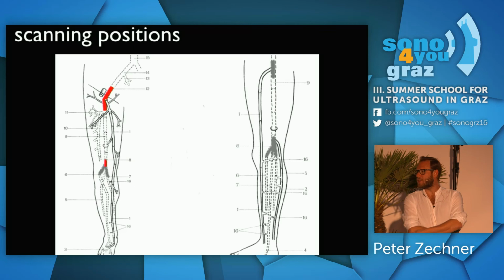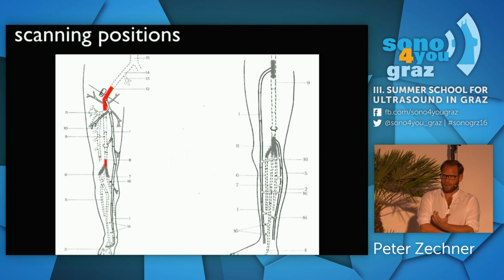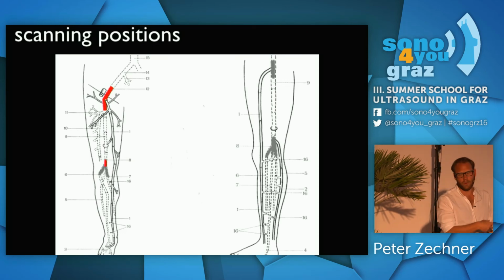Of course, we have to be aware that we cannot find every thrombosis, especially if the thrombosis is localized in the lower leg.